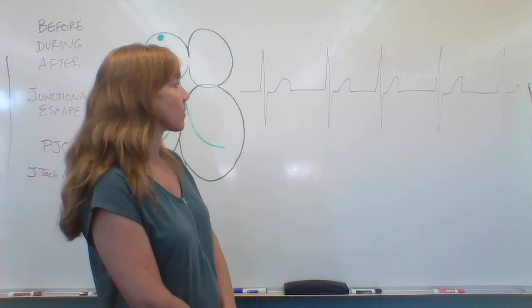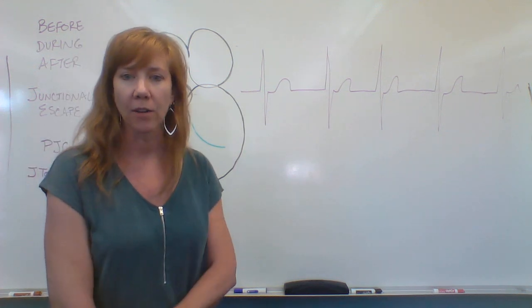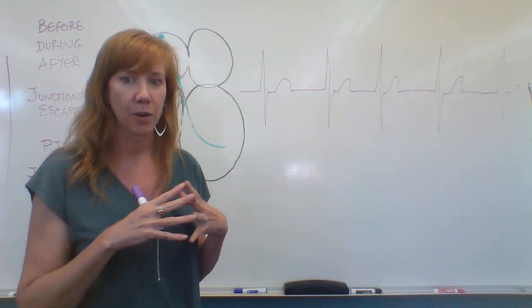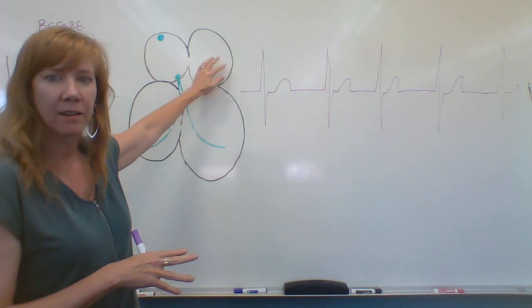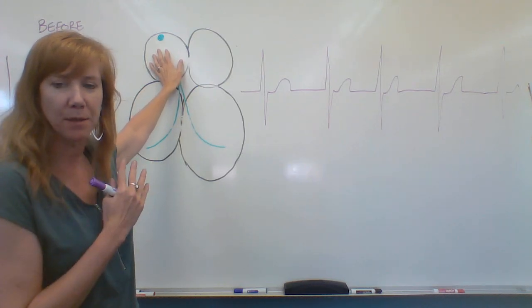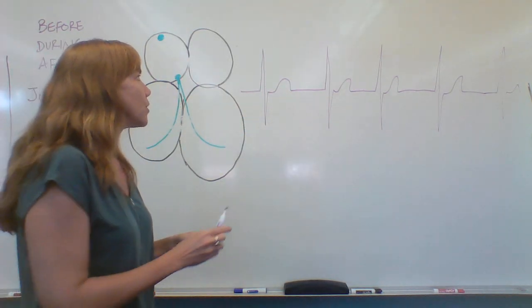So, okay, junctional escape rhythm is a temporary thing. Nobody is going to be able to walk around all day long or for the next month in a junctional escape rhythm. It's always a temporary fix that your body's doing for you to keep you going until this guy comes back from wherever he is, or we get you a permanent pacemaker, or figure out what your problem is. This is just a standby. So this is junctional escape rhythm.